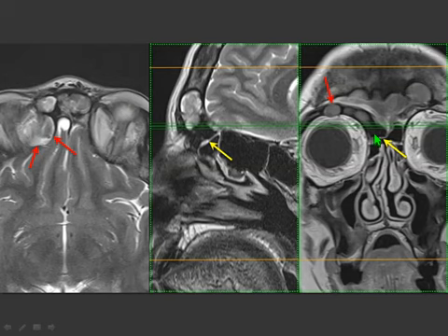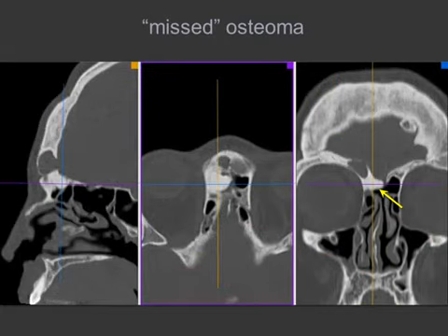That could explain the fact that you have a chronic blockage of the drainage from the frontal sinus and from the anterior ethmoidal cells, but not a chronic blockage of the maxillary sinus. If you review the study done in another hospital, you understand that you are dealing with something that has not been correctly reported.